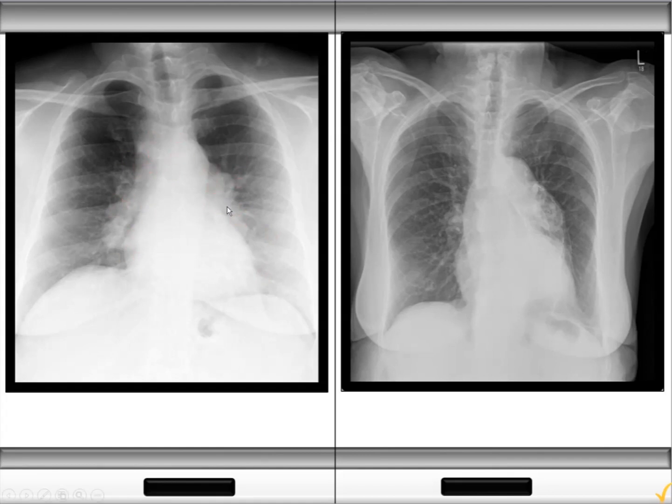That can mean a variety of things. The two things we're going to discuss today related to hilar lymphadenopathy are tuberculosis and sarcoidosis, but there's other things as well, by all means. The other thing we're looking for is the mediastinum in general to make sure that the mediastinum is the proper width. Now, in this case, we have a widened mediastinum. So the aorta should come up. It should have a knob, possibly.